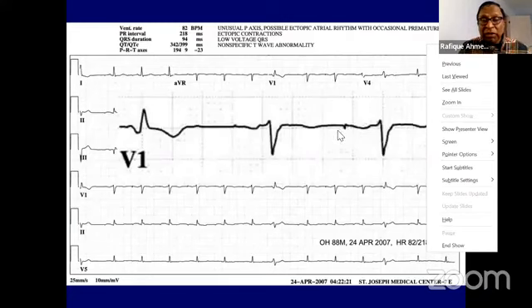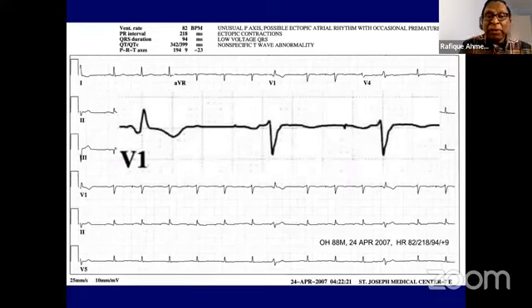So you have to pay meticulous attention. And if you have doubt, then you look at the clinical history of the patient. By the way, does this patient have a pacemaker? There is no magic wand to figure out this ECG. A lot of times I just investigate. I see something, I think it is a pacing spike. And the other thing is, can it be an artifact? If it is an artifact, it will not be present in every QRS complex.